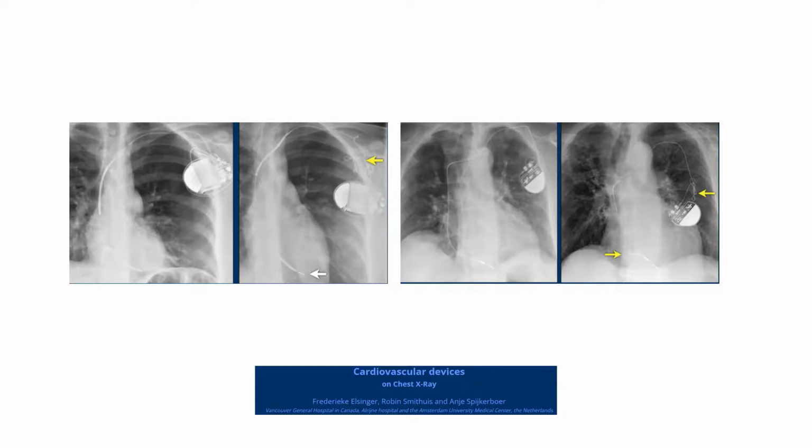That's why it's part of the counseling of the patient not to play on this site, because it might lead to this damaging scenario, when the device migrates and pulls the lead away. And once the lead is pulled away, the problem sometimes comes up. First of all, the pacemaker will malfunction. It will lose its capture and so on.